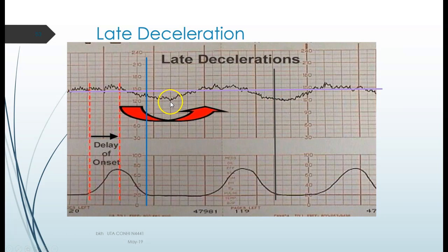So I have a few more minutes. This one doesn't make me panic as much as I would panic if this was absolutely flat, because both the absent variability and our late decel tells us we've got a hypoxic kiddo.